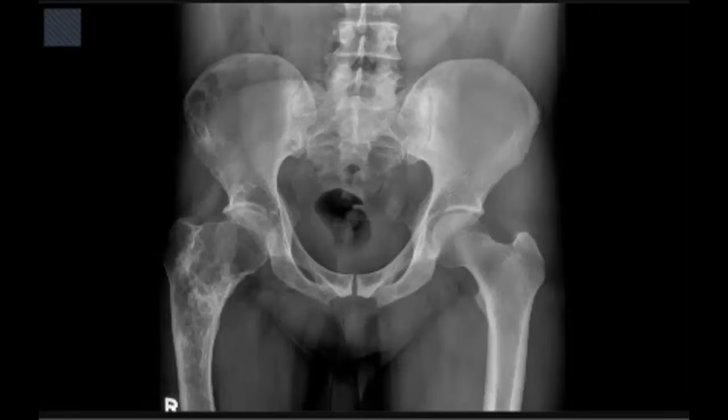Yes. Okay, so I'm presented with a frontal radiograph of the pelvis for a patient with hip pain with no trauma, in which I can appreciate that there are multiple lucent areas noted within the proximal femur and also the iliac bone and the acetabulum, with abnormal contour of the femur, and areas of sclerotic septations inside. It appears to be a multi-septated lesion.